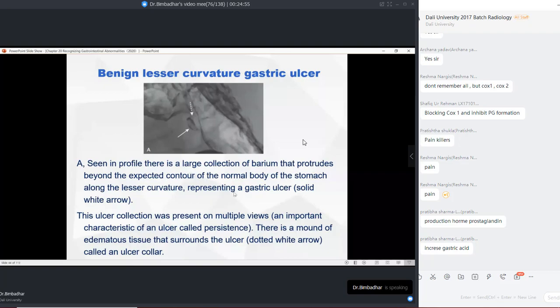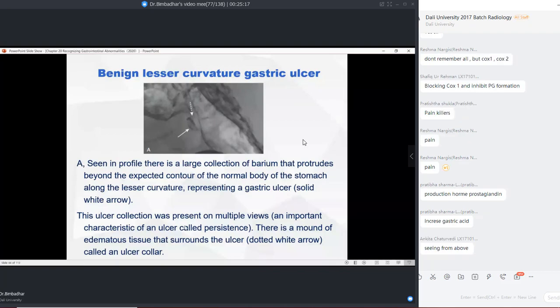See, this is actually a profile view. Okay, last time we looked at what a profile view and an en-face view are, right? So can somebody tell me what a profile view is? Okay, profile view is you are trying to look down, seeing from above.